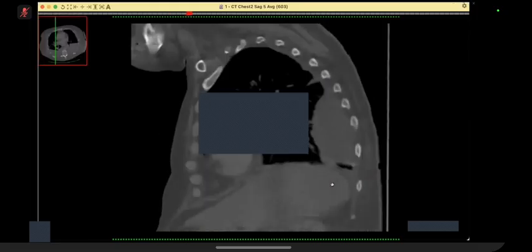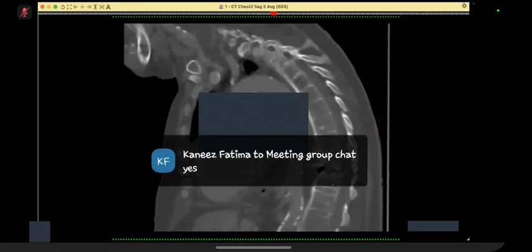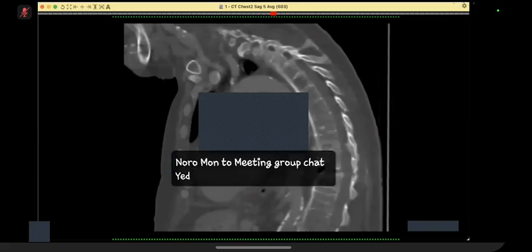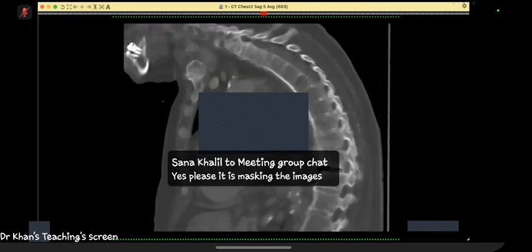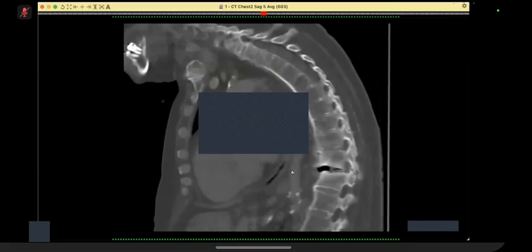I'm trying to look for any fractures in other vertebrae. I can see some fractures within the vertebra just above the vacuum phenomena with some sclerotic areas and some lytic areas within it. What is your conclusion? I think this is a case of ankylosing spondylitis with fracture involving one of the dorsal vertebrae, and this needs urgent orthopedic referral.